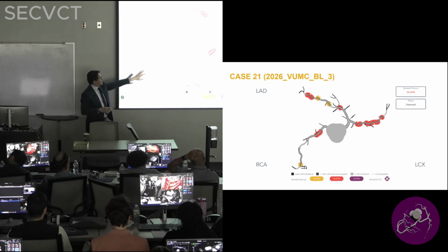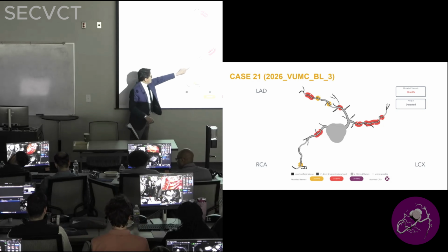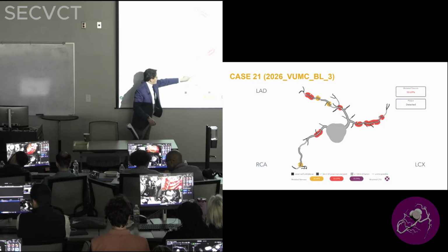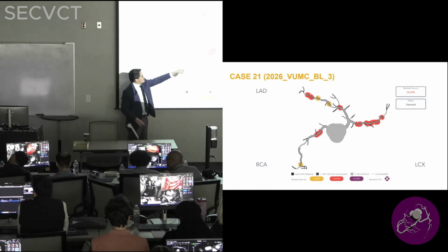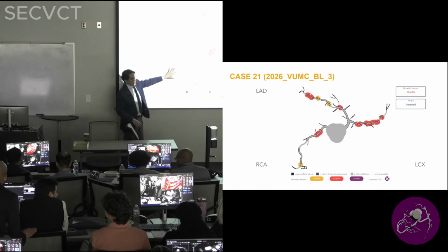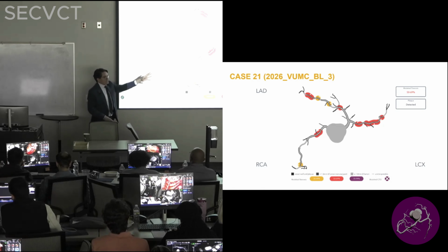So in this case, the circ and the areas that I was concerned about, you can see that it was reconstructed here. The other thing that you can see is the dashes, the areas that are thicker. These are areas of plaque, so plaque is detected there. So you can see where there's plaque, and you can see also where there's stenosis. So this is a preview of what the FFRCT will show. And I know that they reconstructed the vessels that I wanted, and so that's why we decided to send.